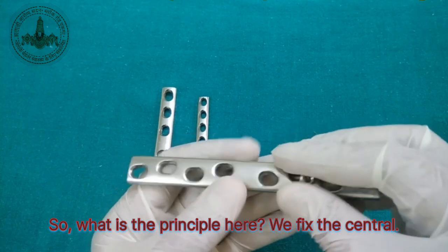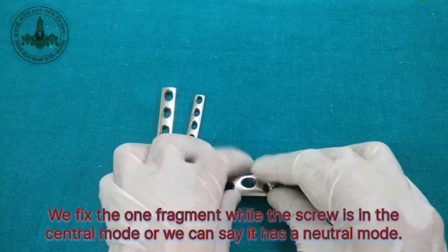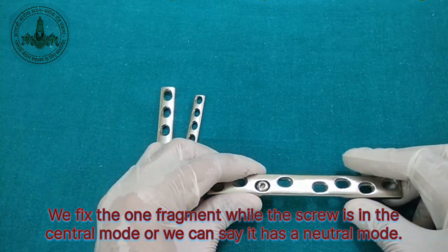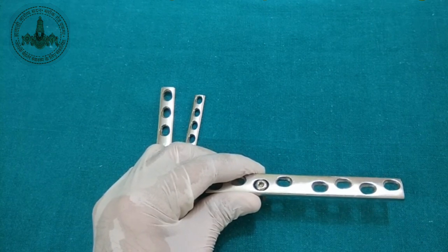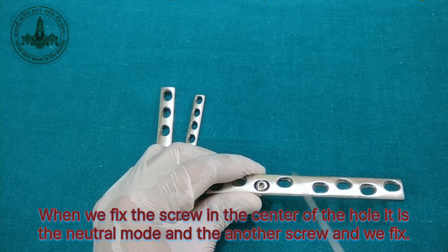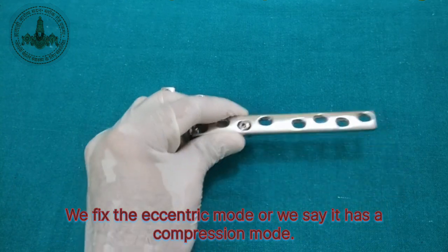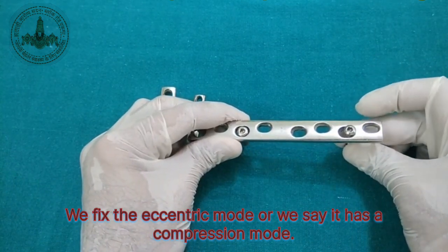So what is the principle here? We fix one fragment while the screw is in the central mode, or we can say the neutral mode. When we fix the screw in the center of the hole, it is the neutral mode, and the other screw we fix in the eccentric mode, or we say the compression mode.